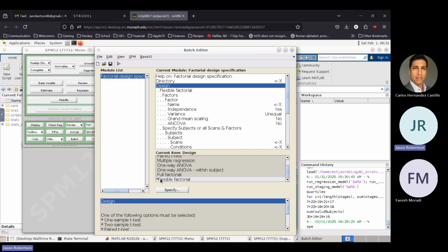But here, the important thing is that you have the simple models. For example, you can choose a t-test, and basically you have 2 columns, right? Your patients and your controls. But in the case that Jason is also including other variables of interest, so he has, for example, site, right? He just showed us that he has age and maybe ICV. So now he cannot just choose a regular t-test, because the t-test simply will compare these 2, right?